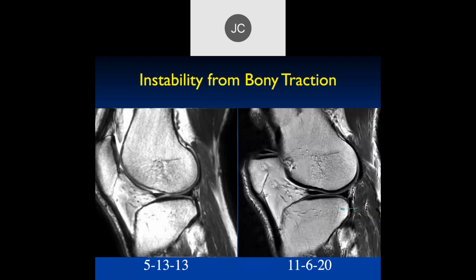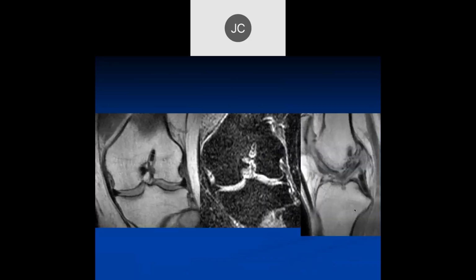Okay. Alrighty. What do you see here? Beautiful low field study. Yeah, so we see an ACL graft. I'm just looking at the positioning on coronal view. Yeah, okay. Let me just tell you, there's no graft here.